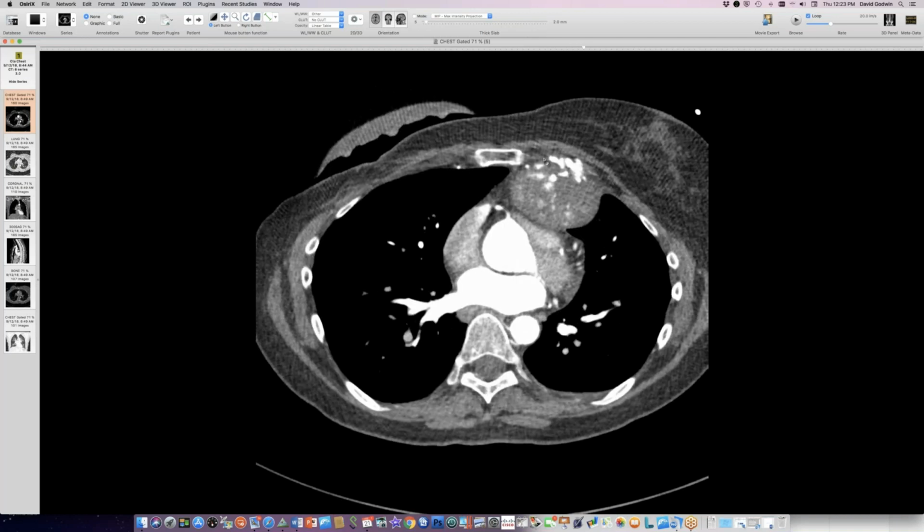So, have you guys seen any of these before? Oh no, I think this is my first, a well-circumscribed cavernous hemangioma. Wow, no, I don't think so.